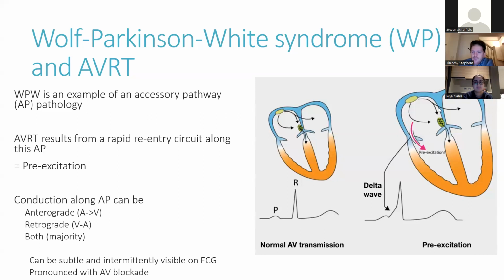That's what's happening in Wolff-Parkinson-White too. That is still occurring, but at the same time you've got this signal coming down through the accessory pathway, and both appear on the ECG at the same time. When you conduct through your accessory pathway, that's not going down your motorway, your designated conduction pathways. This is going down the back roads, which is slower. That's why you can see a slow upsloping here, because depolarization of the ventricle is going to occur slower than your normal highway conduction. That's what causes this upward slurring.